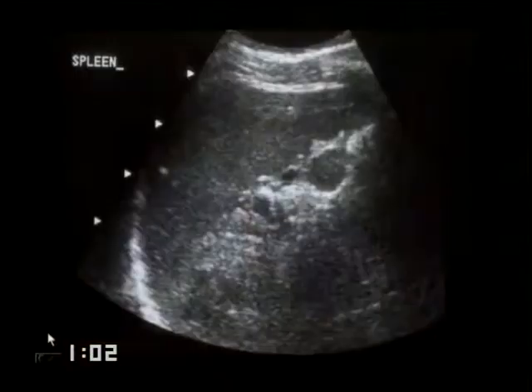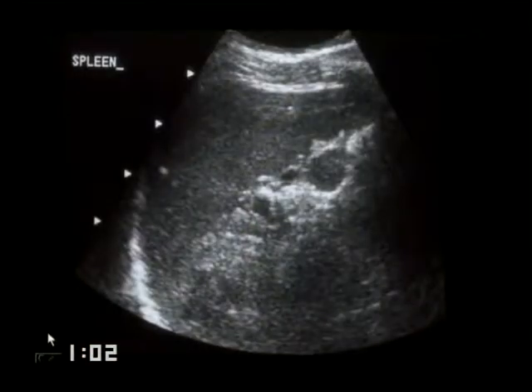If I ask you to raise your hand, how many people have seen accessory spleens on CT, almost everybody raises their hand. And if I ask how many people have seen accessory spleens on ultrasound, nobody raises their hand. Well, that obviously can't be true. You're probably just seeing it and not recognizing it. The way you recognize an accessory spleen, whether on ultrasound, CT, or MR, is that it has the same enhancement or texture characteristics as the main body of the spleen. That's basically it. It will look like splenic tissue in terms of its texture and enhancement characteristics.